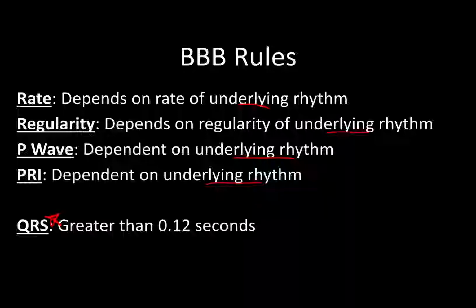That being said, I'm going to take a little bit of time now and focus a little bit closer on how to measure these QRSs. What a lot of it really comes down to is the J point and how to find that. So if you think about a typical clean QRS, the way it's supposed to look, you just have your isoelectric line, you get your R wave, comes down to an S, comes up, you get a nice horizontal line, and then your T wave, correct?